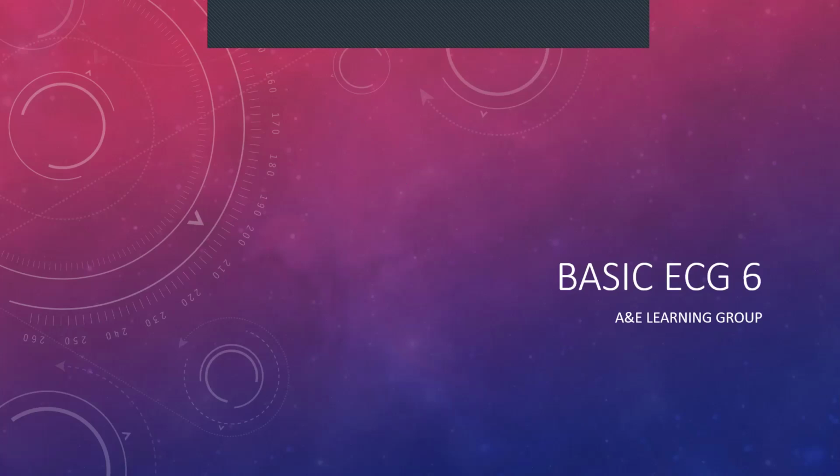So we're going to get into today's ECG. I hope you had a chance to see it on the group. It was quite an interesting one, and there's quite a bit to go through on it. So I'm going to try and show you how you would approach such an ECG, because there's a few things that need to be seen on it.